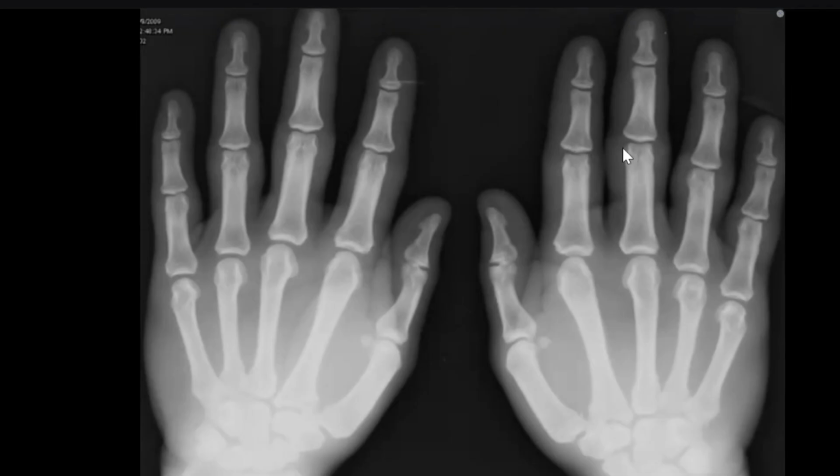Sir, what is your concern? I was concerned about thyroid acropachy. First, I was suspicious for raised bone marrow density. But no periostitis. What else? I will help you. Sir, the length of the phalanges is increased. Yes, sir. What else?